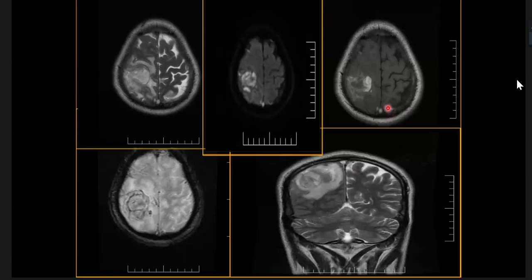Excellent, Dr. Purnima. If you see, this is a T1 hyperintensity, which could represent slow flow stasis or a thrombosis. T2 again shows there is a loss of flow void. GRE is showing the blooming images. It is in the venous territory of the superior sagittal sinus. So when you see the image, always remember to see the flow voids. Very important, when you jump to the conclusion that it's a mass or a tumor, first of all, it is in the subacute stage.